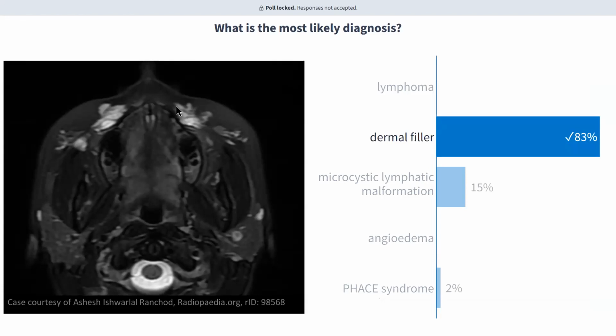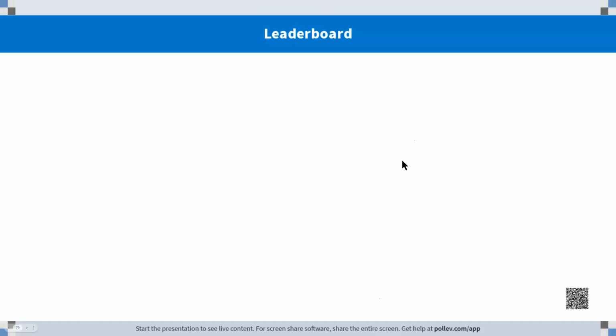I have seen these mistaken for veno-lymphatic or lymphatic malformations, as well as facial masses, when sometimes patients develop a granulomatous reaction to the facial filler. It can look more inflamed, but the typical distribution is this on axial images. So knowing that and correlating that with any history of dermal filler is key to this diagnosis.